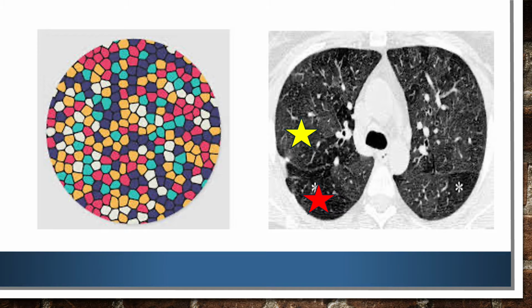of the lung. So, when we are looking at mosaic attenuation, we may see certain areas with a particular density, others with another, intermixed with different densities. So here you can see a white density and a black. So white and black or gray and black shadows which are interspersed in the lung parenchyma, and these are mosaic attenuation. So mosaic attenuation is a general term, a descriptor term that shows that there are geographic areas of different lung attenuation in the lung.